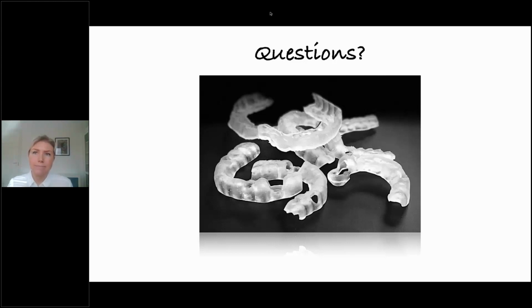So the answer is yes, you have to deal with scatter. You can play with the threshold settings on the volumetric rendering until you can get the best balance of removing artifact, but also keeping the data you need, but also having the incisal and cuspal data by taking the CT scan in an open bite. I can maybe think of literally one case where I was worried about it being merged accurately. Otherwise, I pretty much can get it to go every time.